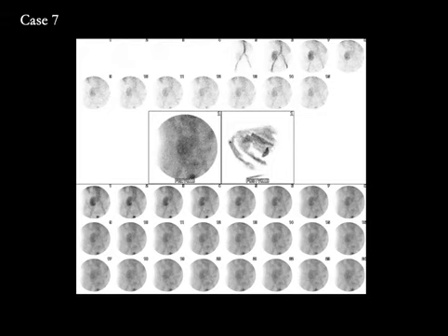Another case with similar findings, we are evaluating a transplanted kidney in the right hemipelvis which shows normal flow, and look at the function. It takes up the tracer and then the tracer washes out of the kidney. There is some activity here in the pelvis, but look at that activity. It's seen on the first image as well. So this isn't urinary bladder activity, this is penile blush activity. So the kidney takes up the tracer and then the tracer washes out back into the soft tissues, and there is no production of radioactive urine. So again, good blood flow, compromised function, ATN versus cyclosporin toxicity.